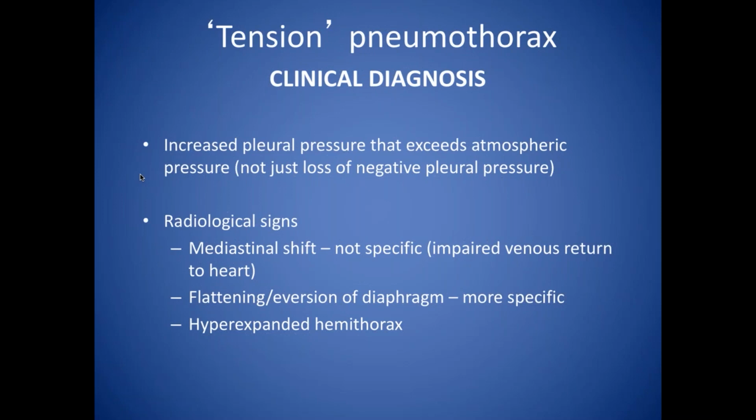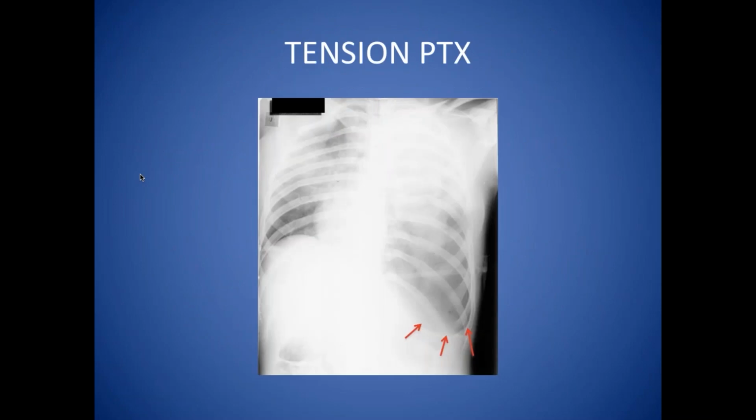So I was always taught at medical school, don't do an X-ray in this situation, recognize the problem clinically. And I think that holds true today. But quite often we still get patients who have tension pneumothorax on X-ray and CT. So here is a tension pneumothorax. The patient has got contusion of the left lung. Note that this is a patient who is supine, and it's a ground glass appearance to the left hemithorax, because not only is there a tension pneumothorax, but there's a tension hemopneumothorax.